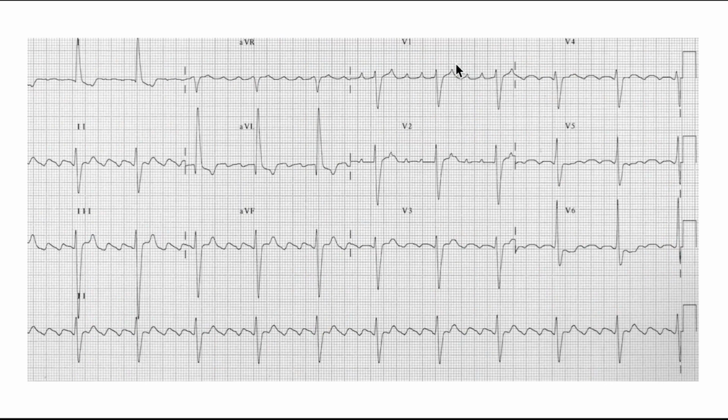Here's one of your favorite diagnoses ever. You're going to love it, because it's always so distinct. That's a flutter, but what I want to show you is, hey, it looks like there's a P wave before every QRS, but there's multiple P waves, and so you can tell that it's not a regular rhythm. So this is something considered a flutter. These are actually called F waves.